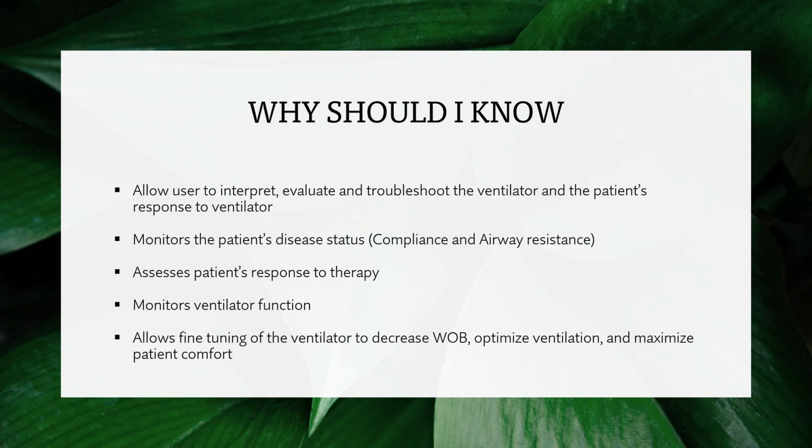So why is it necessary for you to know about it? If you are working with critically ill patients, it is important to know how to read these graphics since it helps in allowing users to interpret, evaluate and troubleshoot the ventilator and the patient response to ventilator. For example, if there is a leak in the endotracheal tube balloon, you can recognize the problem while looking at graphics.